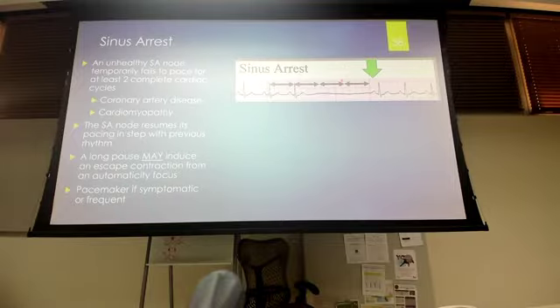And that's how you know this is a sinus block, 1 cardiac cycle, versus sinus arrest, 2 cardiac cycles, versus just an escape beat. An escape beat or escape rhythm is occurring just after where that cardiac cycle would occur. So just after that cardiac cycle, it's not falling in rhythm. It's just a little later than it should occur.